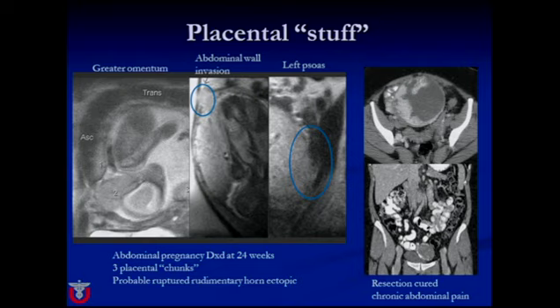Luckily for her, she was safely delivered of a live baby, and the placental tissue was left in situ because it was impossible to consider how you would dissect it off of the psoas muscle, out of the abdominal wall, and off of the greater omentum and colon. Early on, this was the appearance. There was still perfusion of these placental tissues, and you'll see how it's adherent to the colon here. Over time, it involuted and shrunk down to this mass.